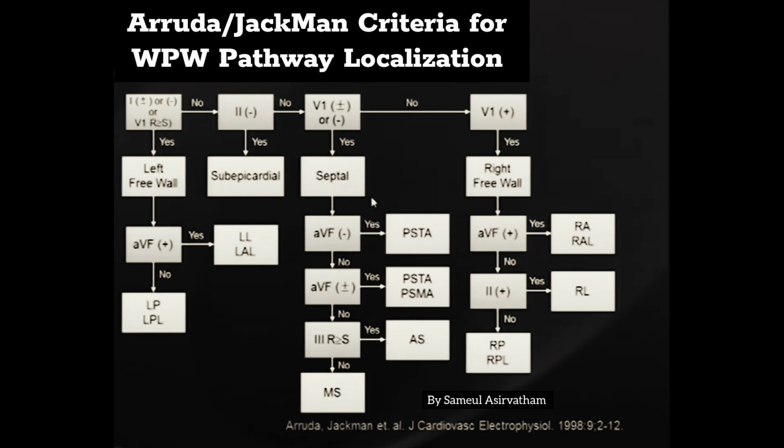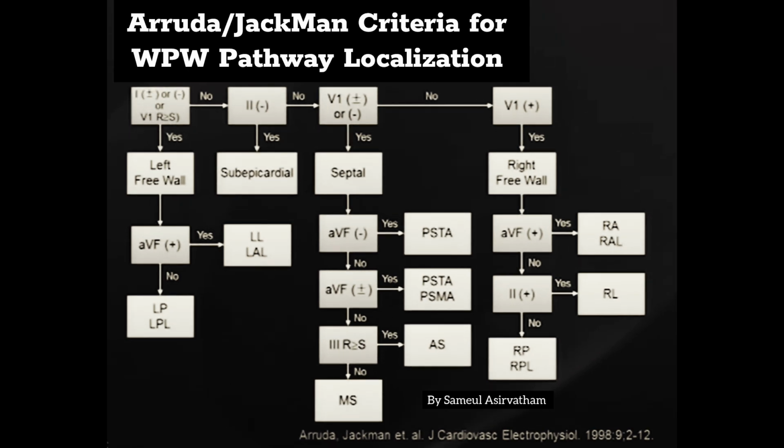And then the rest is quite intuitive. It's the way we think of ECGs all the time. 2, 3, aVF positive, it's more anterior; it's negative, it's more inferior, and so on.